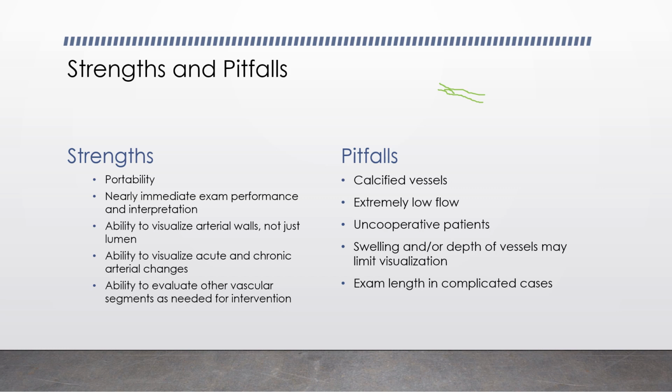Okay. It also allows us to visualize acute and chronic changes. So over time, plaques can change, so we can look for some of those changes, and we can see things in real time. We also have the ability to evaluate vascular segments as needed for intervention. So you don't have to inject contrast that'll affect the whole body if you're doing an ultrasound exam like you would with an arteriogram. You can just assess the area of interest.